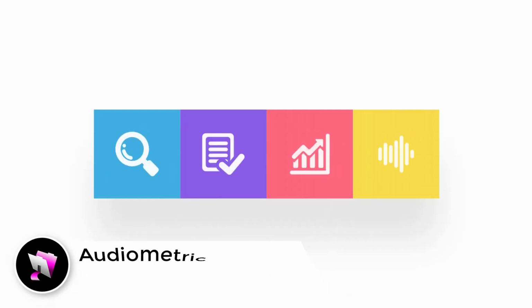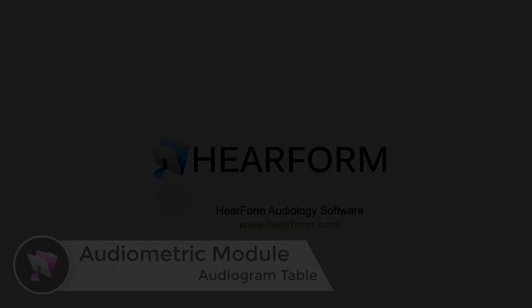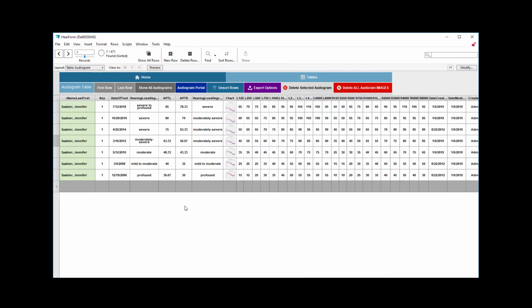Welcome back. This video will provide a brief introduction to the Audiogram Table in HearForm Pro. Perhaps the easiest way to get to the Audiogram Table is to click the Audiology button and then the Audiogram Table button.